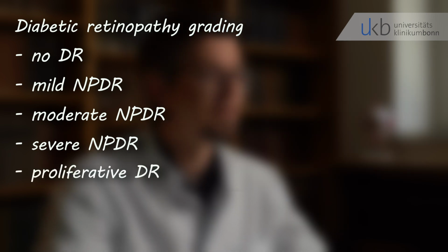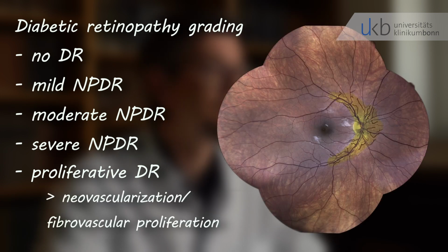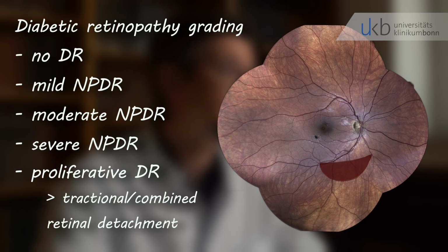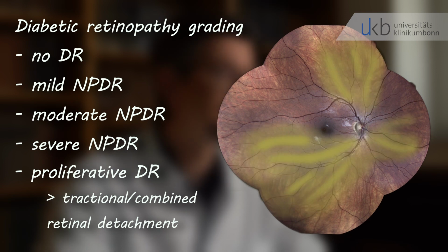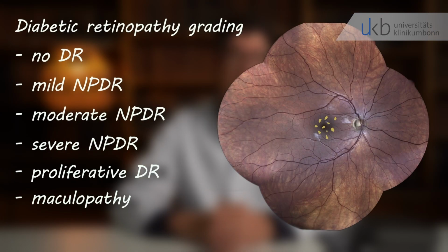Proliferative diabetic retinopathy is defined by the presence of one of the following signs: neovascularization or a fibrovascular proliferation, vitreous hemorrhage or pre-retinal hemorrhage, tractional or combined retinal detachment. How do you recognize diabetic maculopathy? If you see exudates in the macula, it is highly suspicious for diabetic maculopathy.